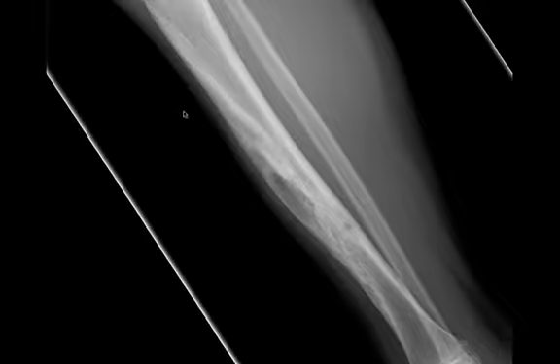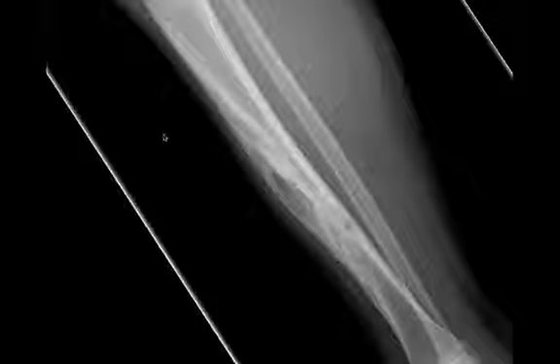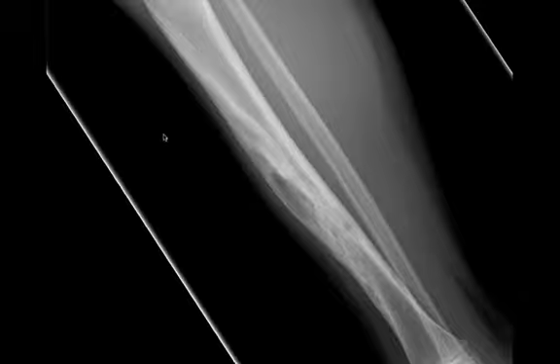In this case, this was an adamantinoma, which is a rare malignant tumor which almost always occurs in the tibia and can look very much like a crazy non-ossifying fibroma. So when you see something that looks like a very aggressive or large or kind of crazy looking non-ossifying fibroma in the tibia, it's going to be cortically based, and you're going to think of an adamantinoma because this is actually an aggressive, malignant tumor and needs to be treated, as opposed to a non-ossifying fibroma, which you don't need to worry about.